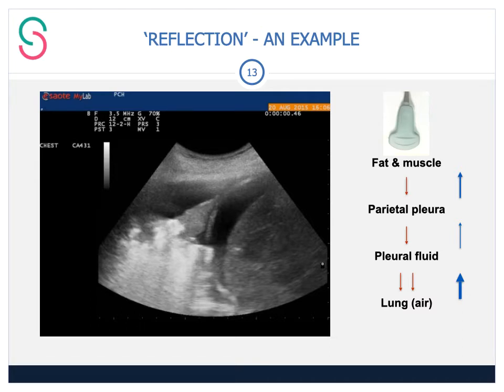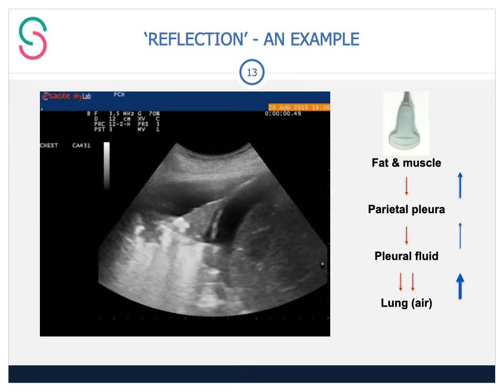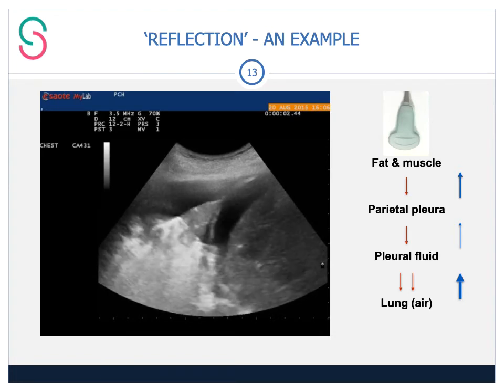And the other thing you also observe in this image is that the area beyond the pleural effusion, therefore the lung tissue, is very, very hyperechoic. That means bright. And this is partly a function also of the sound wave traveling faster through fluid medium before it hits a structure where the sound waves are slowed down, creating this very bright echogenic structure. And you can see it as I play the video.